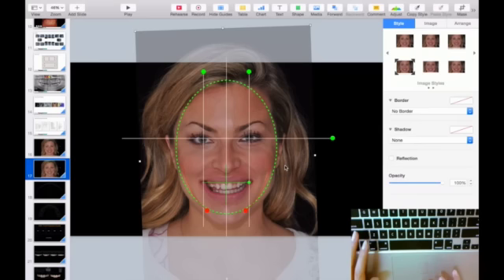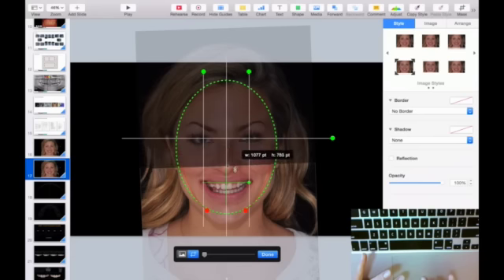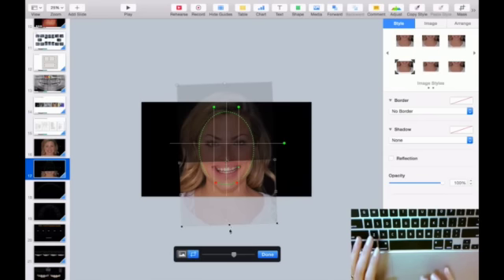So I'm gonna mask this picture. For that, I double click and I get on the little square, pull it down, and I'm gonna cut it till I get the mouth. If you don't see the end on this side, with the 2 fingers you make the picture smaller, and you go and you make this smaller also.